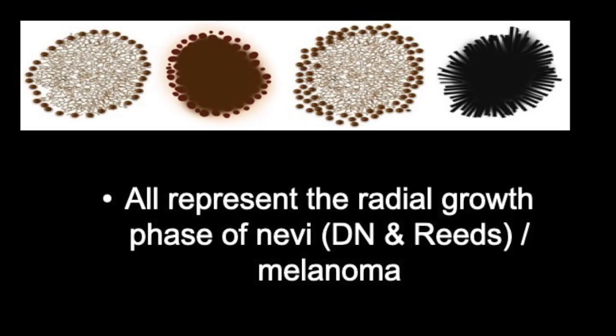In terms of the starburst pattern, these all are in some variant of starburst, yeah? This peripheral globular pattern that we spoke about, benign, is in fact a starburst pattern, but it happens to be one that we now know is totally benign and we can exclude. But if you have the peripheral globules but not network, that's a totally different story. Those lesions and the ones that have multiple tiers of globules, and those that have a classic starburst pattern with streaks and pseudopods, those represent spitzoid neoplasms.